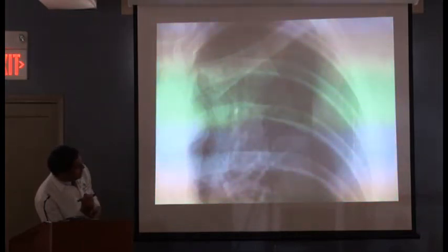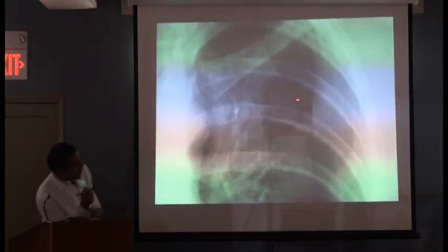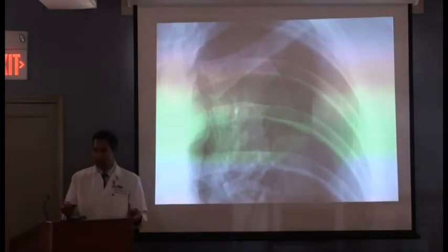Okay. So this is just a close-up of this. See the white lines coming out to the end of the lung here? See that? There's the lung edge, and there's the air. All right, remember, black is air. So if there's a lot more black going on, you've got to think about something that could be happening.